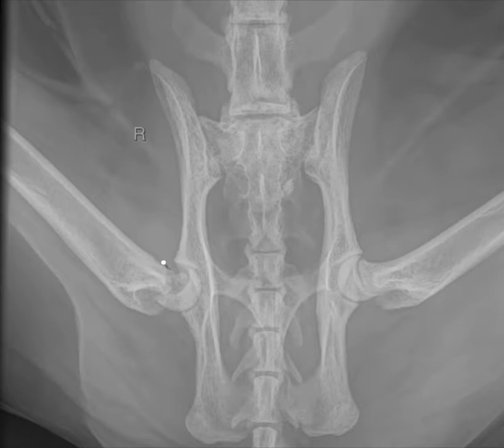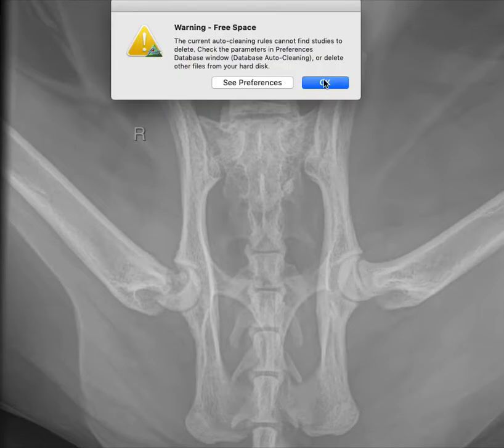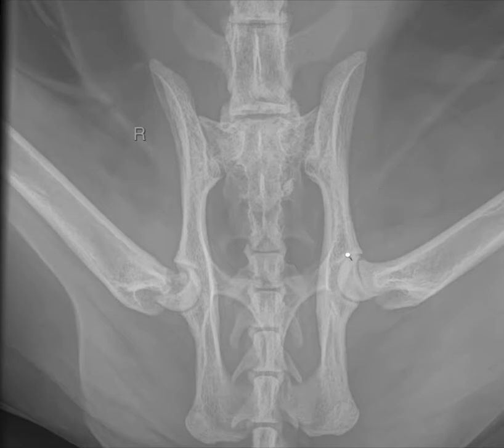You can see that on the right side, there's increased radiolucency in the region of the femoral neck, and there's a sharp margination between this and the femoral epiphysis. On the left side, we notice that this area is appropriately aligned, so when I trace the femoral margins, it all seems to be contiguous. However, what is abnormal on the left side is that there's an open physis in the proximal femur, which is unusual given patient age.